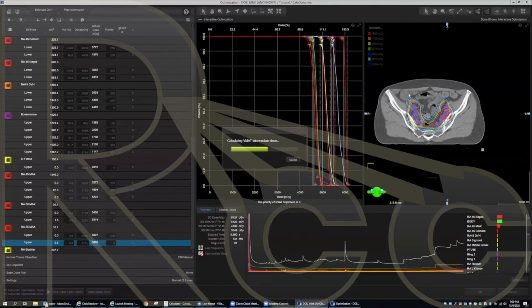I wouldn't create any other hot or cold or any other helping structures. I'd use exactly what I have. I would just jump back in and fine tune these shoulders, fine tune the tails, fine tune the ring. That's all that I would do.